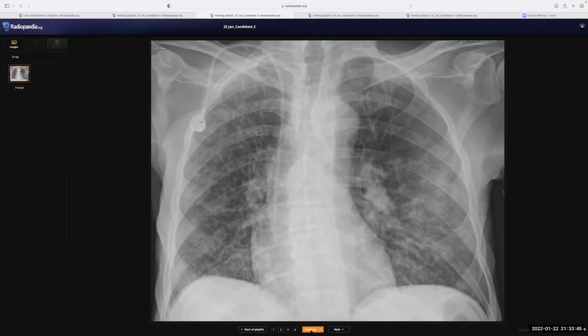I can see that there is diffuse interstitial thickening in both the lungs. I have the impression that there is a subtle lucency along, I hope you can see my mouse, along the periphery of the left hemithorax. No, you can ignore this. Okay. I'm looking at the heart size, which appears to be normal. I'm looking at the trachea, almost centralized with a bit of kink in the distal part.